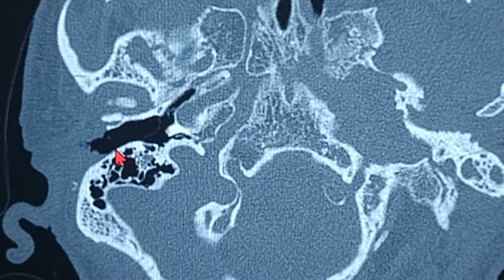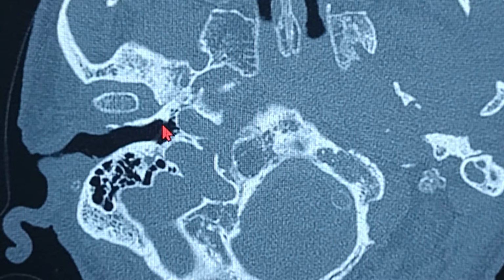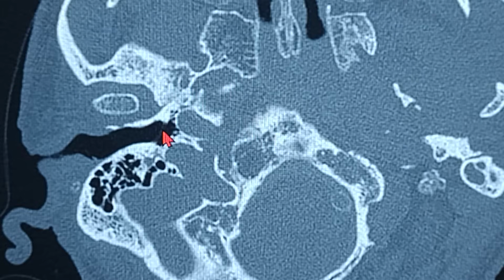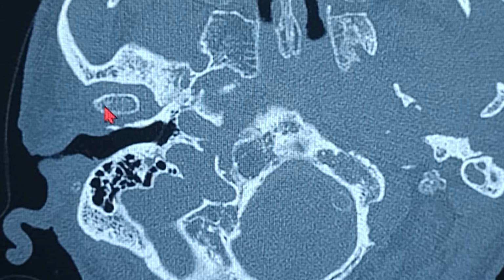You can slowly start seeing the tympanic membrane right there. This is a faint structure you can see over here, right? That's the tympanic membrane right there. Now remember, this is the axial view, so you're going to see a slant view of the tympanic membrane. Also, you're going to see a slant view of the tympanic membrane on the coronal section as well. Okay, so you can see a faint structure over here. That's the tympanic membrane, clearly seen on your screen. And you can see the temporomandibular joint. Now you can see the fossa over here.